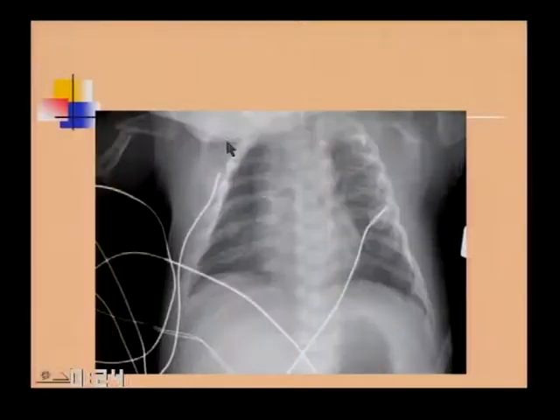but is also seen in children with trisomy 21. So if you were to see that in a child who had congenital heart disease, a big heart, or some other manifestation of trisomy 21, 11 ribs or 13 ribs, you'd be home with a diagnosis. A child such as this, born with multiple rib fractures, an acute fracture of the humerus, might also have foreshortened, curved femora, is an indication that this child is born with osteogenesis imperfecta.